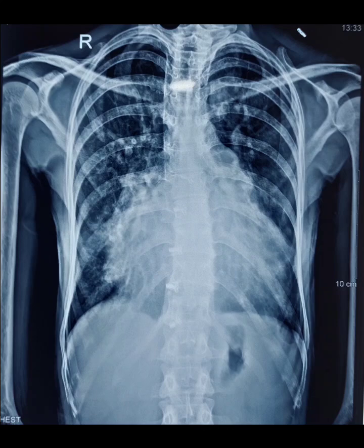So this was a 40 years old female. She presented in the OPD with shortness of breath, NYHA class 2, since long, almost around 1 year probably. And she has palpitations, intermittent palpitations. So with this history, she presented, and this is the X-ray.